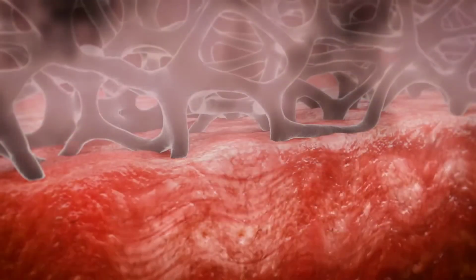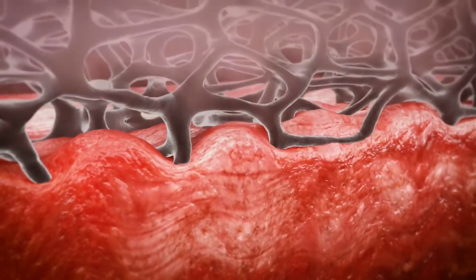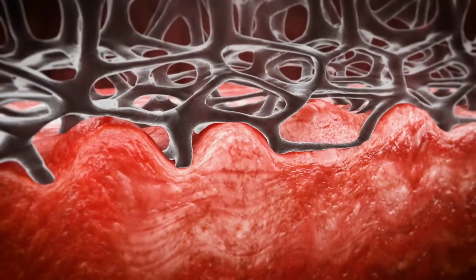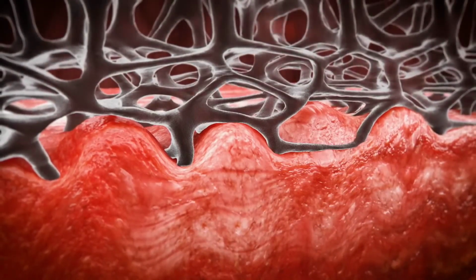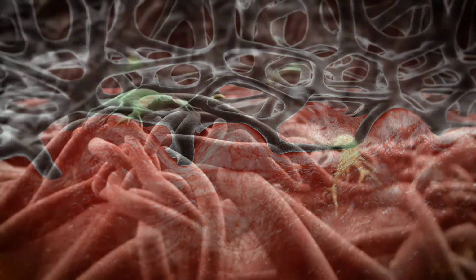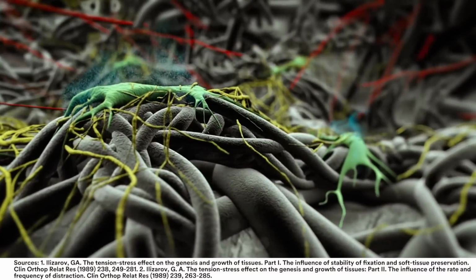The biological responses are initiated as an effect of microstrain, which results from the manifolding of negative pressure across the proprietary 3M VAC granufoam dressing to the wound surface. This creates areas of cell surface strain, also called microdeformation. Tissue microdeformation at the cellular level leads to cell stretch. When cells of any kind are stretched, they are stimulated to expand, become thicker and more metabolically active.